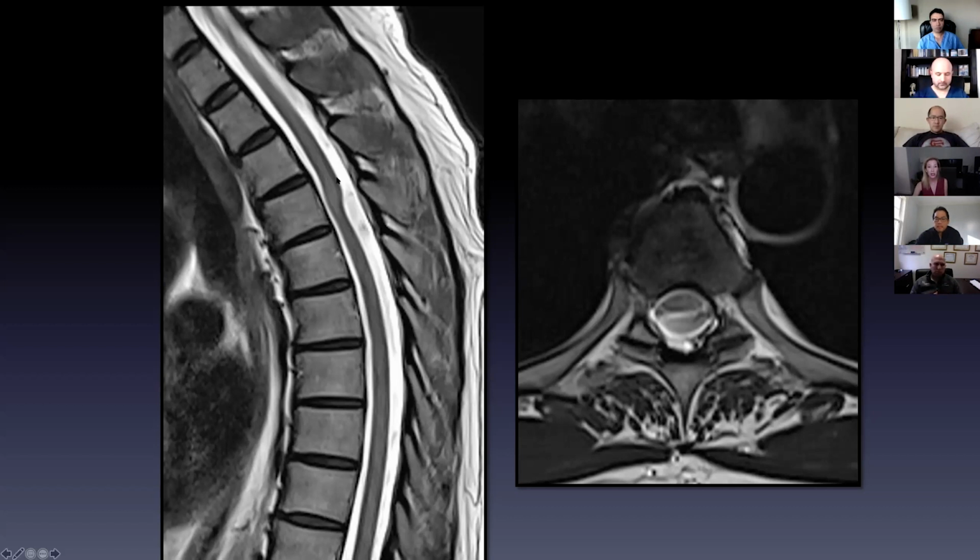The last one was something behind the cord pushing it forward, right? This one is a little bit different. This one has a very focal abnormality in the cord caliber and cord direction. Flow artifacts behind, there's actually nothing behind the cord here. This is all CSF flow artifact. I'm sorry, I'm talking slowly, but I'm echoing to myself. Axial T2 image. Nothing should be within the canal except cord and CSF.